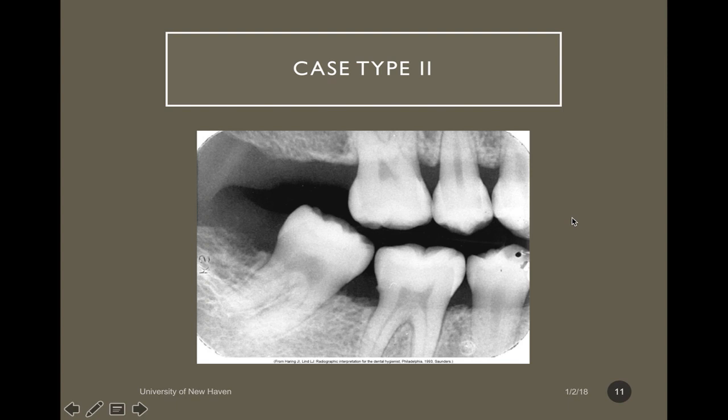And then our ADA case 2 is early periodontitis. This is associated with more mild crestal changes. Our crestal bone may appear more flattened, maybe a little bit deeper than 2 millimeters. I can see it pretty well when I'm looking between our molars here. Here's my CEJ, and I definitely can see some loss of bone. If I'm not sure how much bone I've lost, I can see that there's calculus here, a local irritant that would cause me to lose bone.